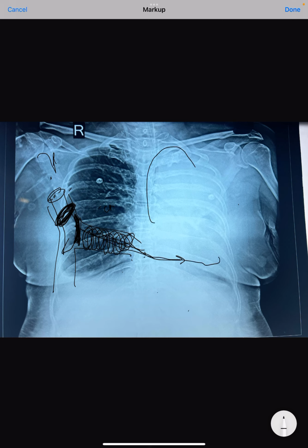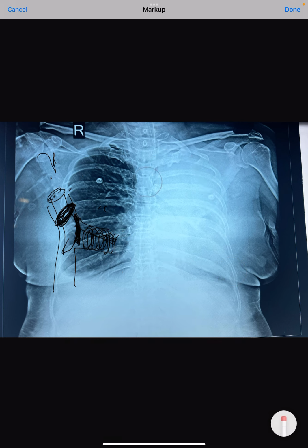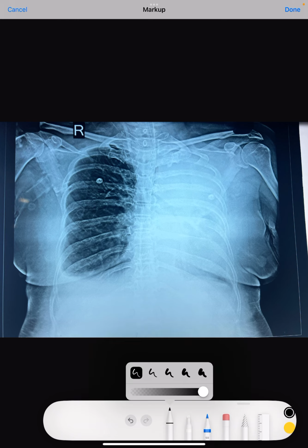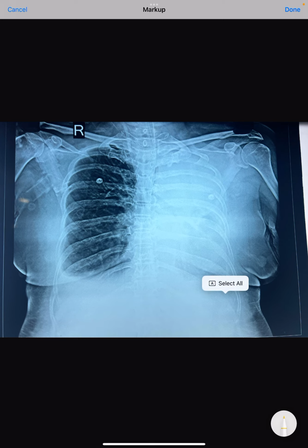So this lung completely gets collapsed, and it will be seen as sudden deterioration of the patient's saturation, because one complete lung is not functioning, not getting aerated. So what you see is sudden worsening of the patient's saturation and complete radio-opacity. So we need to always remember the T4 level. Now how to remember T4? You always remember one thing.